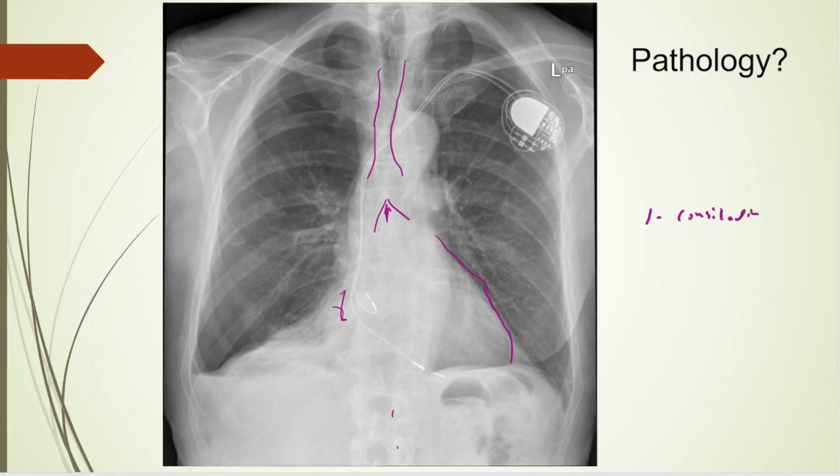So go on, D for diaphragms. You can see the right diaphragm here, gastric bubbles. Left diaphragm, partially visible. You can't see it here, and you can't really see it over here where it goes down. You can see that there's a kind of a line here, and that is a fluid in the right lung. It's blood, fluid, whatever. I don't have the patient history, so I don't really know. So that's D for diaphragms, E for everything else.